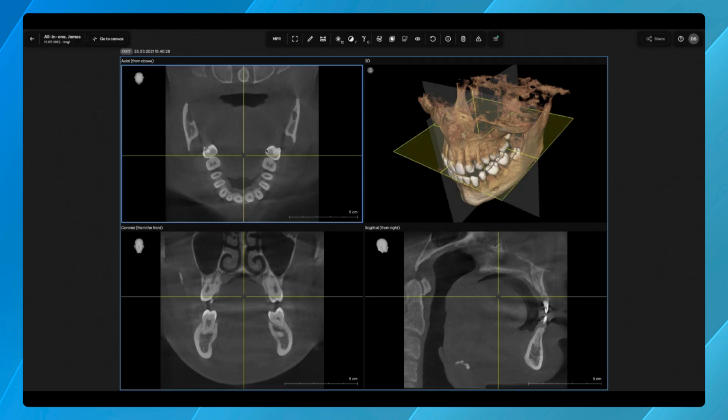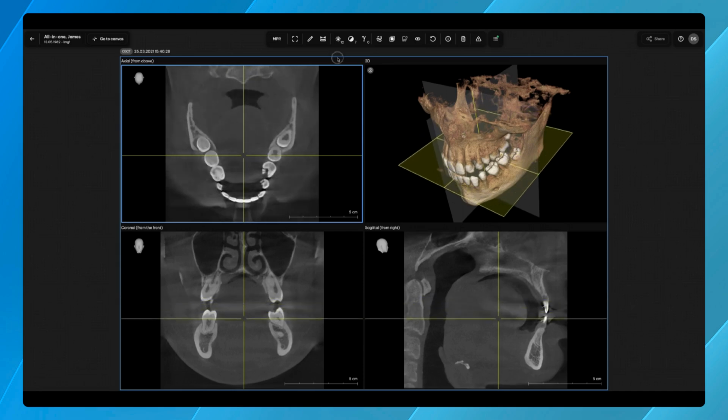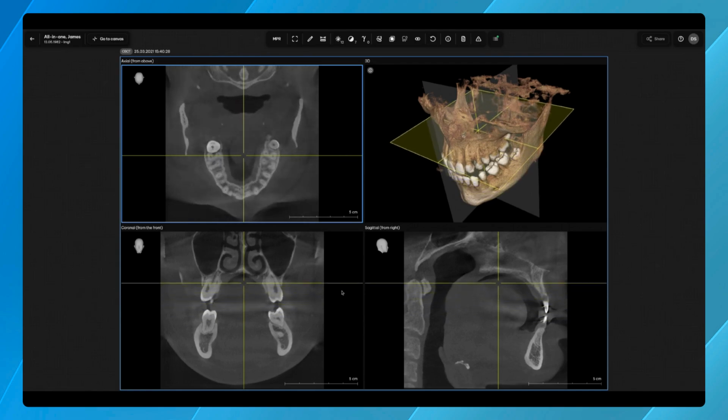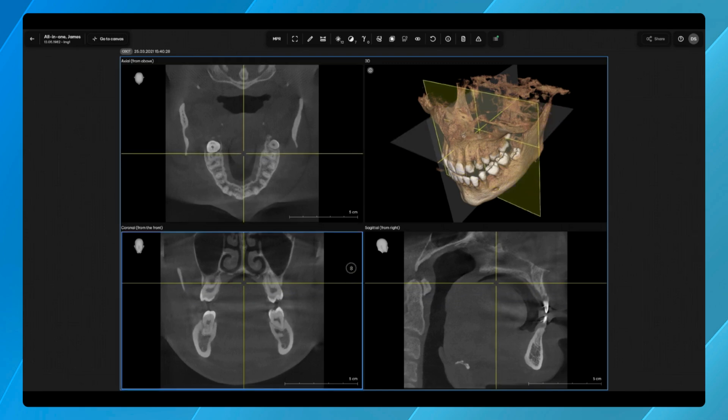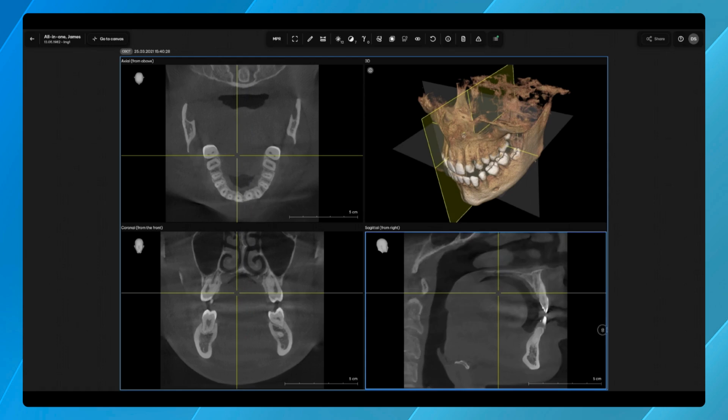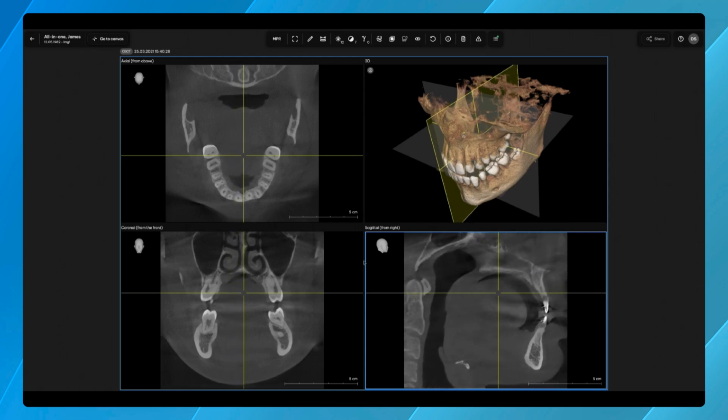This supports side-by-side comparison along the midline, identification of anatomical variations and abnormalities, and supports a systematic approach to diagnose 3D X-rays. This enhancement also supports diagnostic habits in many countries, where dentists are trained to read 3D X-rays using MPR views, making it a valuable addition for 3D X-ray training and educational programs.